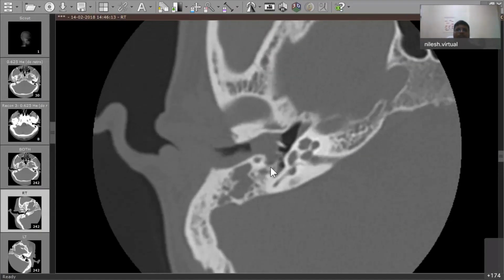Then next thing you have to see whether sinus is anteriorly placed or not. Visually it doesn't look like anteriorly placed. You can just draw a line all along to see very minimally anteriorly placed, but you have to take care on this area. There is some bone dehiscent in this area. So sigmoid sinus is okay. Laterally, sufficient cortex is there.